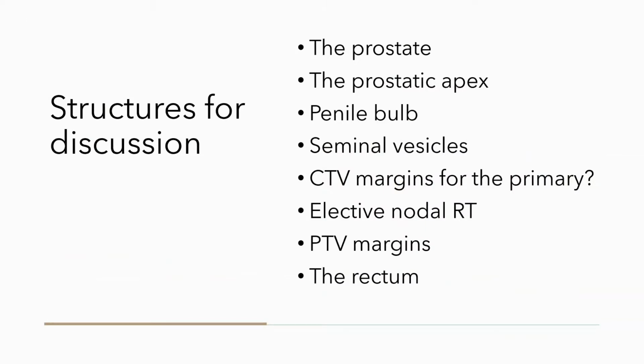Now, before we go into these guidelines, let us take a quick look at the structures that we are going to discuss today. Most importantly, we have to look at the prostate. But apart from the prostate, there are some contentious problem areas that we need to be very clear about when we contour prostate cancer.